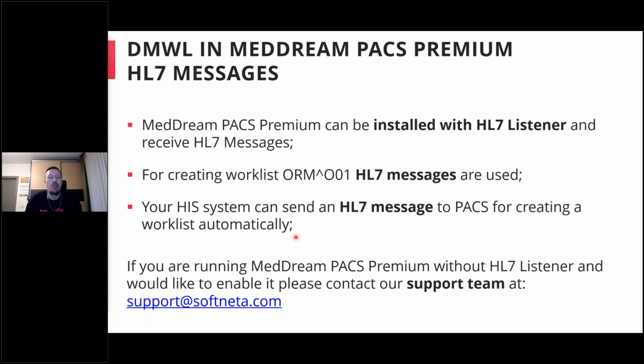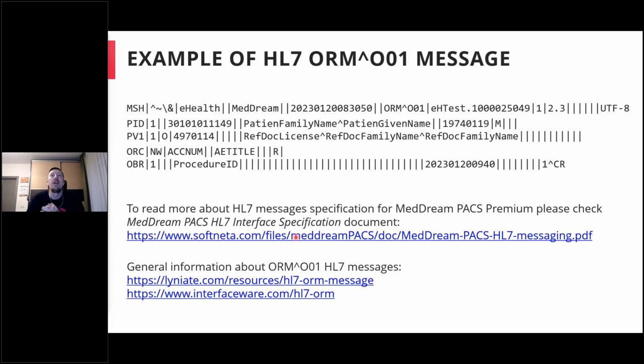They will help you to enable it because it's related to the licensing, so you will not be able to enable the HL7 listener by yourself if you already installed PACS Premium. So please contact our support and they will help you to set up this HL7 listener.